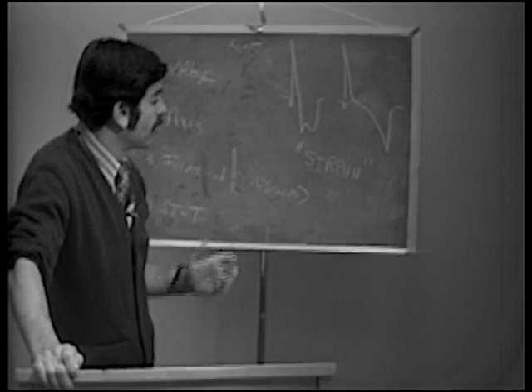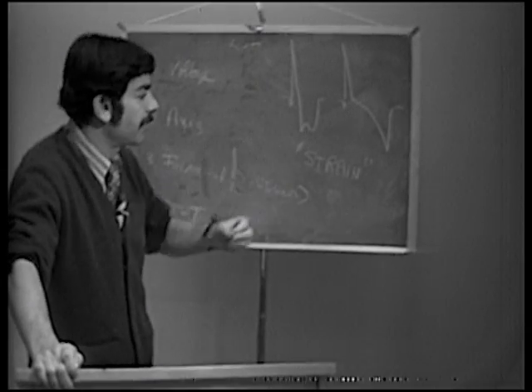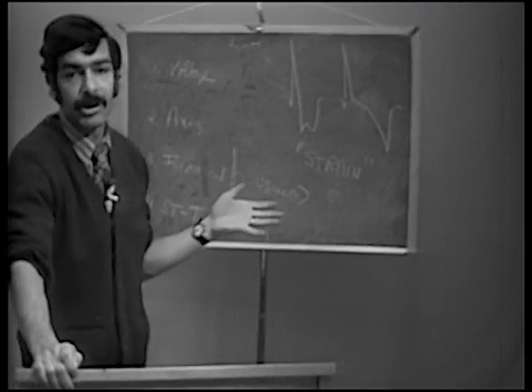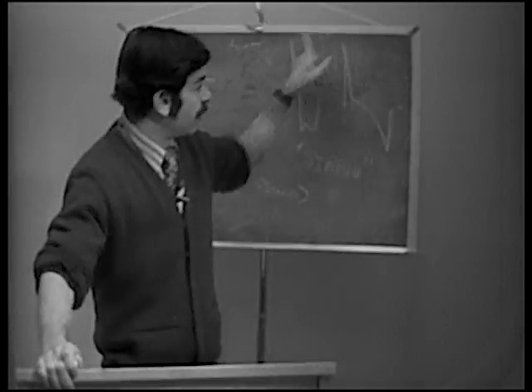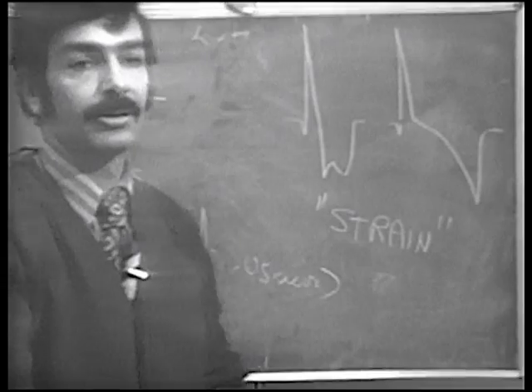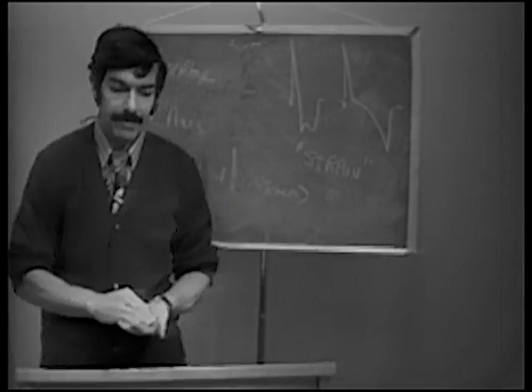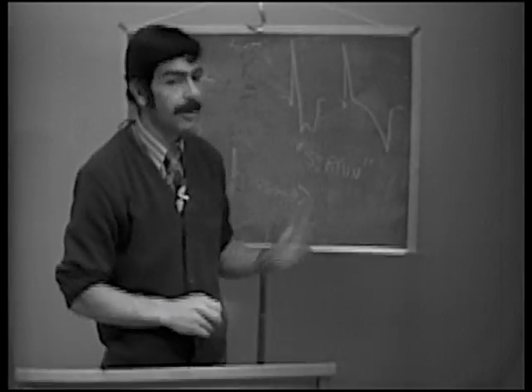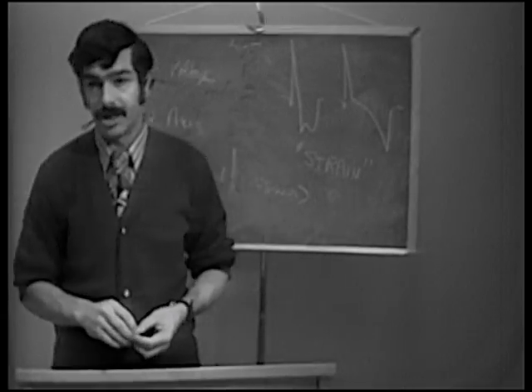Okay, when you see this combination, I prefer to call it left ventricular hypertrophy and ischemia. For instance, that patient may have left ventricular hypertrophy and may have coronary disease as well, may have the combination. So these changes really are not due alone to left ventricular hypertrophy, but may be due to vessel disease as well. Therefore, I think a more objective term to apply to this would be left ventricular hypertrophy and ischemia, but just to point out that this is what people are talking about when they talk about strain pattern.